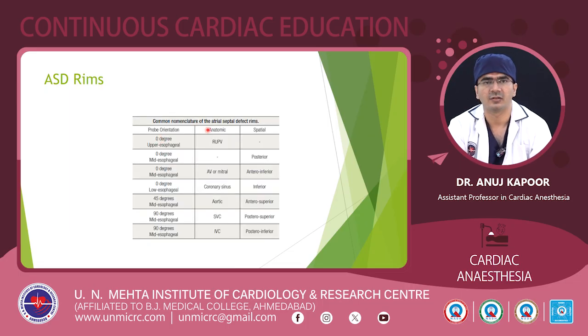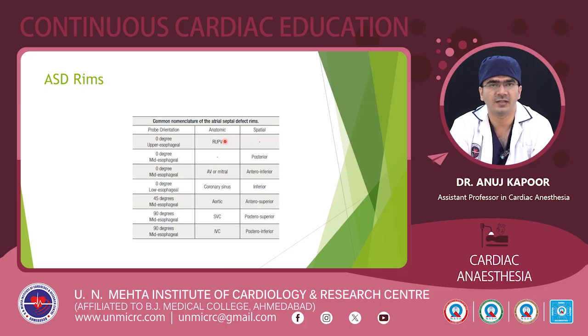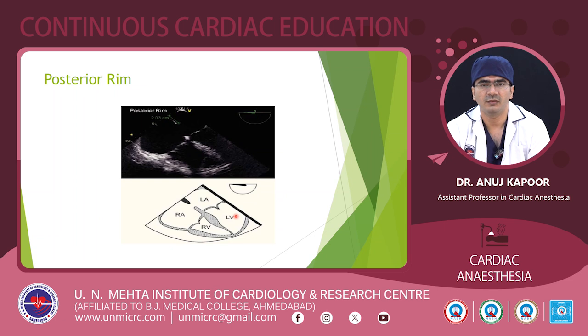These rims are named according to the anatomy and according to the spatial context of where they are present. On the anatomical nomenclature, we have the RUPV, the mitral rim, the coronary sinus, aortic, SVC and IVC rim. And according to the spatial configuration, we have the posterior, anterior inferior, inferior, anterior superior, posterior superior and posterior inferior rims. In the further discussion, we will mainly focus upon the anatomical rims. So, beginning with the rims that we will have to evaluate.